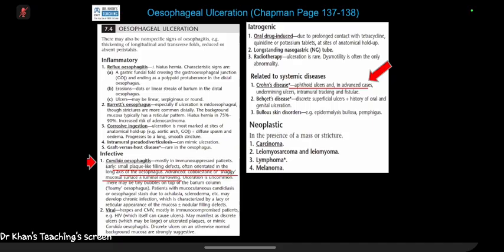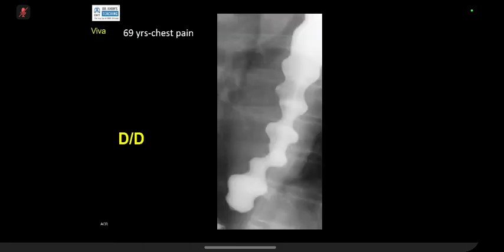Remember this, and they are going to show you in the exam. If you see an aphthoid ulcer, call it Crohn's, right? And they will ask you, why isn't it UC, in a barium enema, for example? Because it's a deep ulcer. UC doesn't cause a deep ulcer. That is why Crohn's disease is deep, right? That is why it goes through the wall. It can then cause fistulations and so on, right? We'll come back to that. So aphthoid ulcers are an exam favorite.